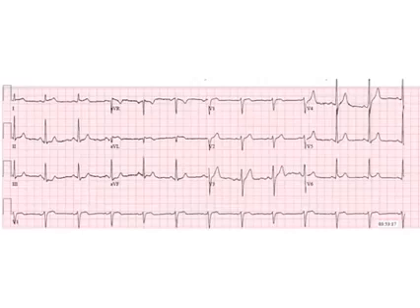Some medical students really get scared when they see V1, V2, V3, and V4 because they see that the ST segment might be elevated, but I was lucky enough to do a rotation with a really great cardiologist when I was a medical student. And basically what he told me is that from V1 to V4, those ST segments are going to get a little bit bigger with each successive lead. So don't be scared. If it's rising proportionally, then it's normal. If they're super off the page, then obviously it's going to be abnormal. And we'll get into all that as we go today.